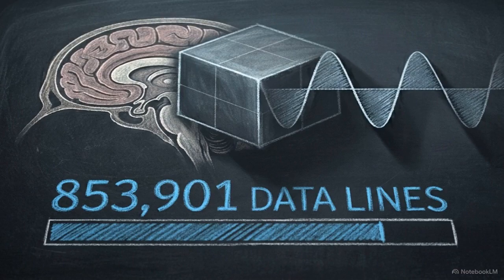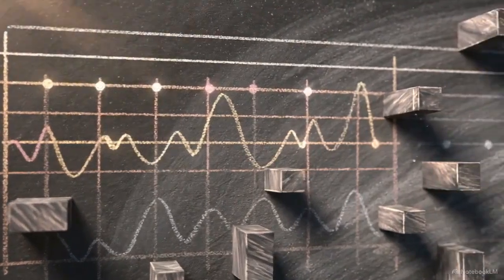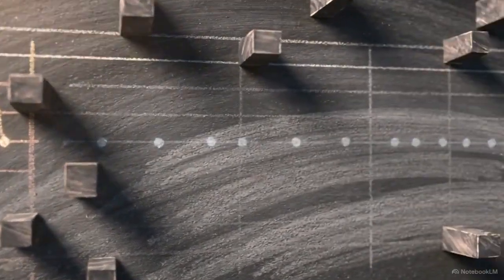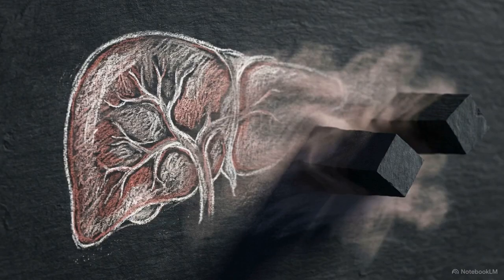The number of lines acquired is the echo train length. A very long echo train length saves time, but it allows T2 relaxation to occur continuously while the data is still being gathered. The fading signal introduces progressive blurring along the phase encoding direction of the final scan.